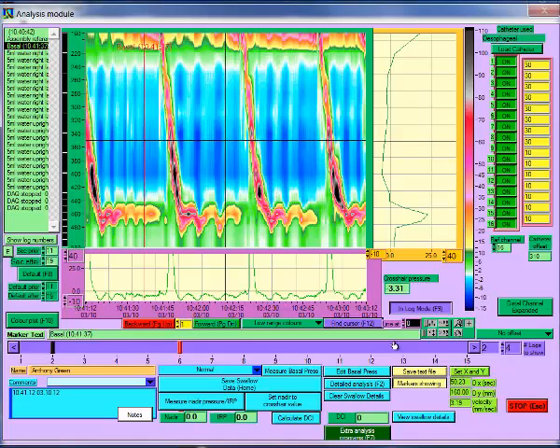Once you have measured the basal pressures, you are ready to classify the swallows and measure nadir pressures. Each swallow needs a classification of its peristalsis, and you need to measure several nadir pressures or IRPs during the study to get a representative sample. It is best to do this part of the analysis in marker mode because the markers were entered at the time of the swallows, so are most efficient to navigate between swallows.